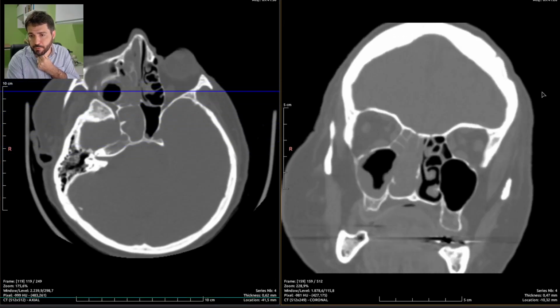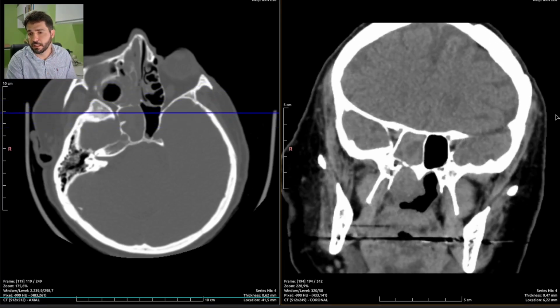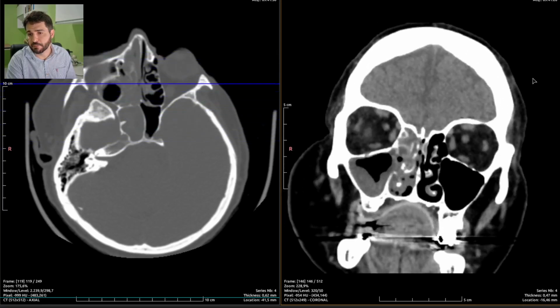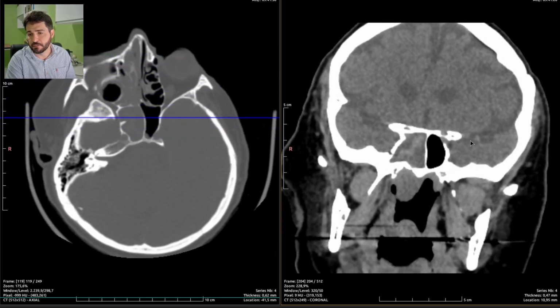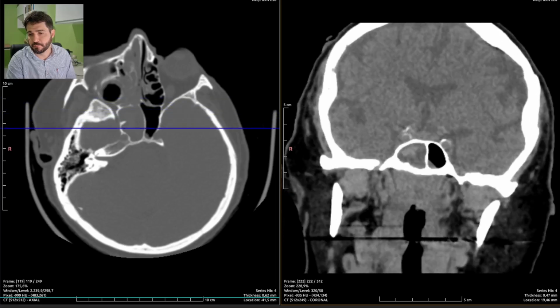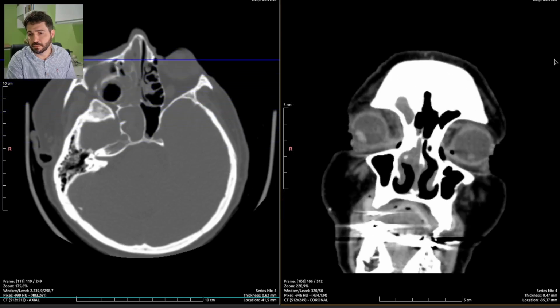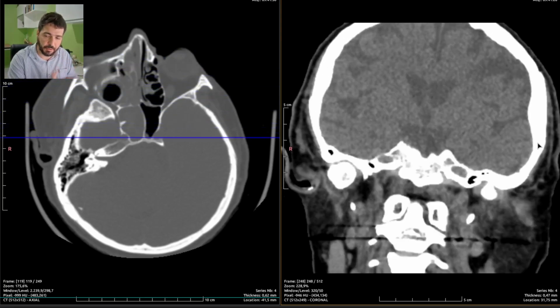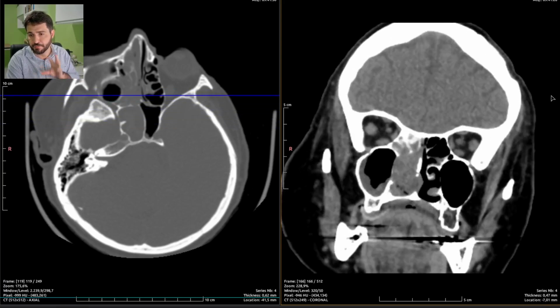So this is probably a major case of cancer, and the rest of the right-sided sinus cavities are also diseased, filled with heterogeneous content, and with diffuse thickening of the mucosa, because the outlets of those sinuses are obstructed by chronic inflammation, and also this expansive and infiltrative behavior of the tumor.